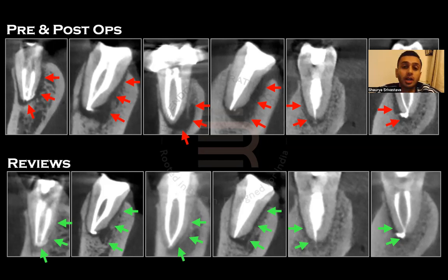You may have pocketing depths as well, only because they need a least path of resistance. Your cortical bone is very, very thick. So either it comes out in the form of a sinus, buccal or lingual sinus, or they will start forming these kinds of lesions, which may be indicative of a vertical root fracture, but they're actually not.